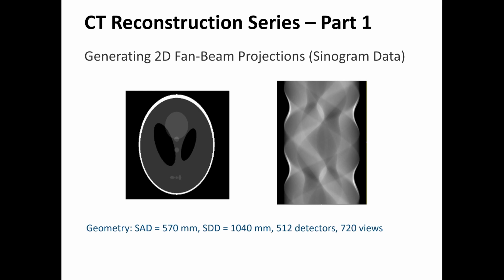Everyone, welcome back. In this video, we'll create synthetic CT projection data, what's called a sinogram, using a 2D fan beam geometry. This is part 1 of my CT reconstruction series, where we start from raw projections and later work up to full reconstructions.